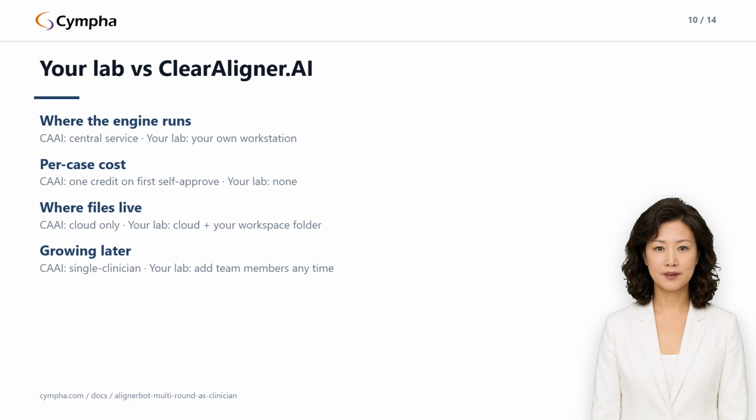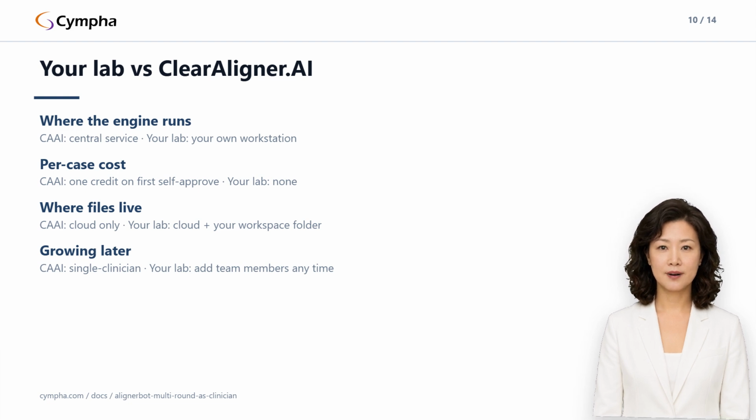Signal 3, you want to take vacation. A solo lab stops when its operator stops. Continuous coverage needs a second user who can pick up cases. The migration is non-disruptive. The new person signs up with the right role, designer, or AlignerBot for another bot seat, naming you as lab manager. You approve them on my team and start assigning. Mid-flight cases stay where they are.